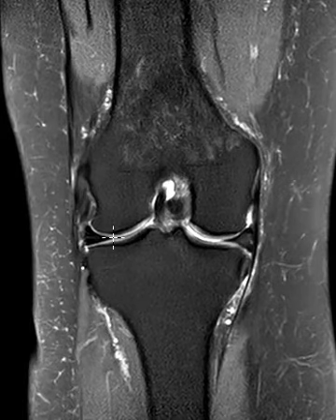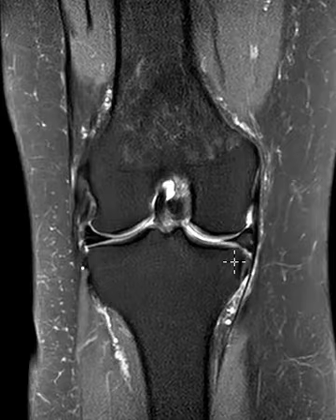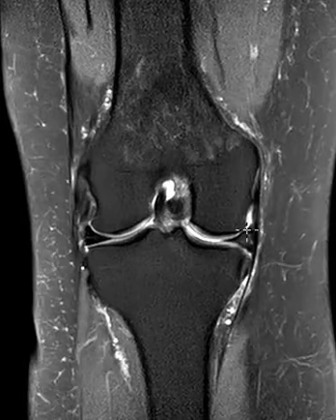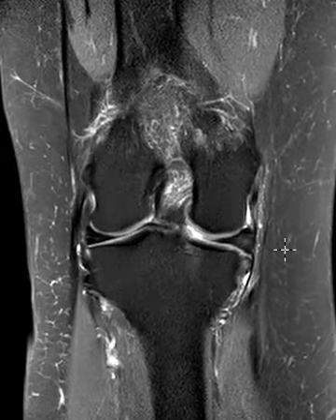So if we look on the lateral meniscus, we see a nice, beautiful lateral meniscus, nice and dark, and it's held in really tightly between the femoral condyle and tibial plateau, but the medial meniscus looks a little more loose. It looks like there's a little bit of pseudo-extrusion, drifted outward slightly. We also see degenerative signal within the meniscus, this foggy brightness. There's a little bit of intrasubstance degeneration.